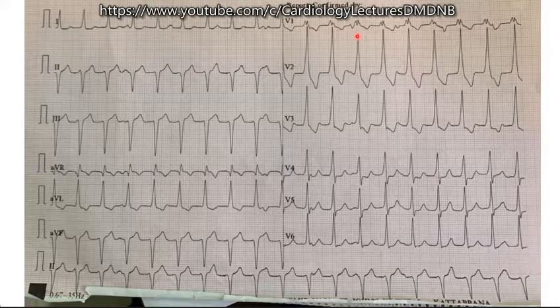So the rate is lower on the lower side. Of course, 120 is enough to diagnose ventricular tachycardia. But when there is a slower rate, you can easily make out the AV dissociation, and so most likely there is a retrograde block, and all those put together, you can always consider the possibility of a junctional tachycardia also.